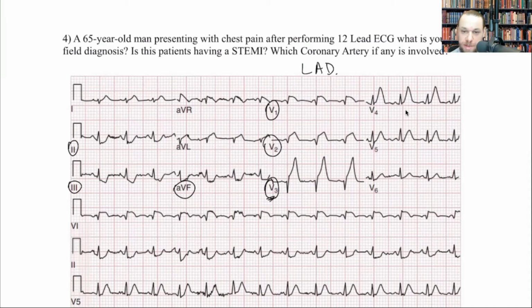And what we didn't see in the previous EKG is that here the ST segment elevations are much more prominent. They're much bigger in amplitude, right? And there is a bigger portion of the heart that's involved. So here the lesion is probably higher up. It's more proximal, right?